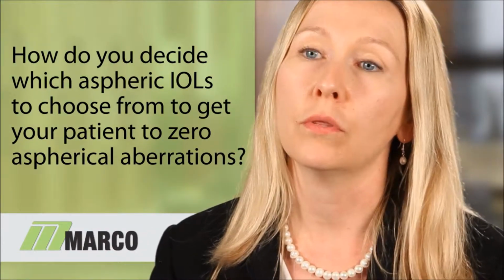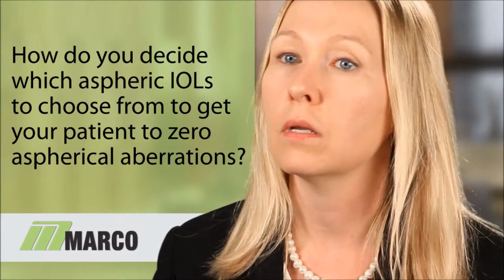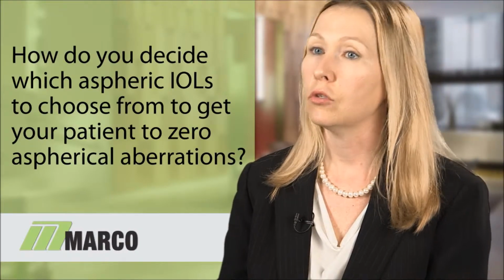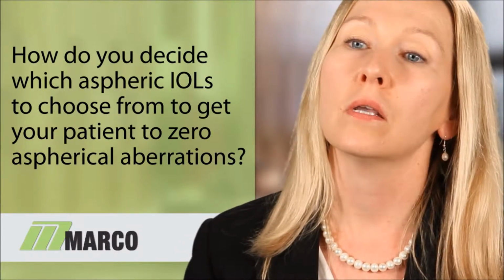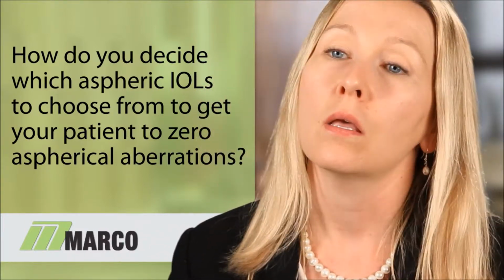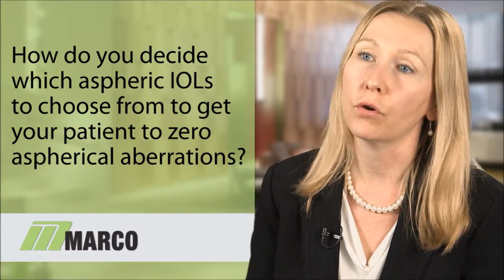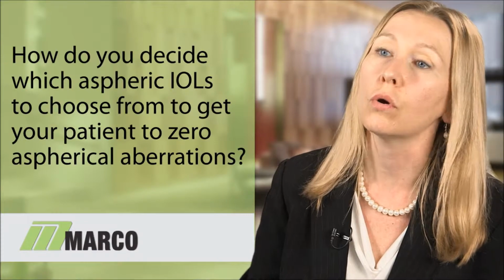An interesting case that I can share with you is that we had a patient recently who presented with a nicely implanted IOL with a best corrected 20/20 vision, who was very unhappy. And she was not a premium IOL patient, but she was still very unhappy. We went to the OPD and realized that she has been implanted with a negative spherical aberration lens of the highest power, and her negative spherical aberrations were extremely high. They were over -0.6. This patient obviously had high negative spherical aberration before surgery, and then the implant added more negative asphericity to her cornea.